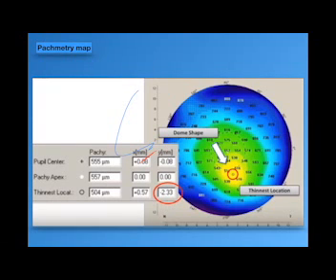in the slide of the topography. The superior thinning, from pannus or scarring or other causes, you will get the thinnest point superiorly. It will show the thinnest location deviating away from the corneal apex, but in the superior part of the cornea at the same point of steepening. This is the thinning of the superior cornea, which could be neglected if, as I answered Dr. Mahmoud Khalil before, there are no correlating weakening factors in that cornea, and the thinnest location is superior at the same point of steepening, you can go for refractive surgery without any fear.